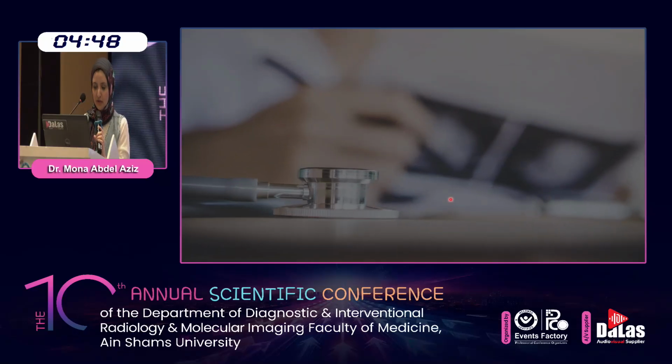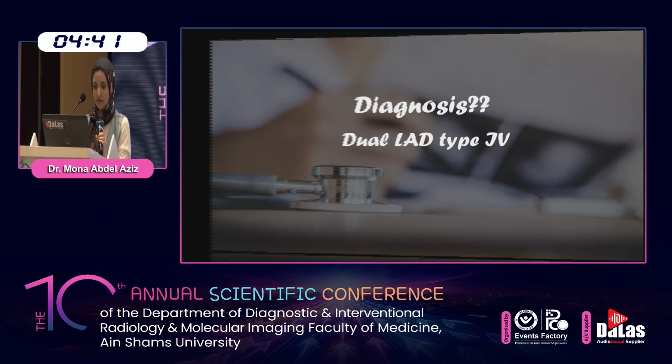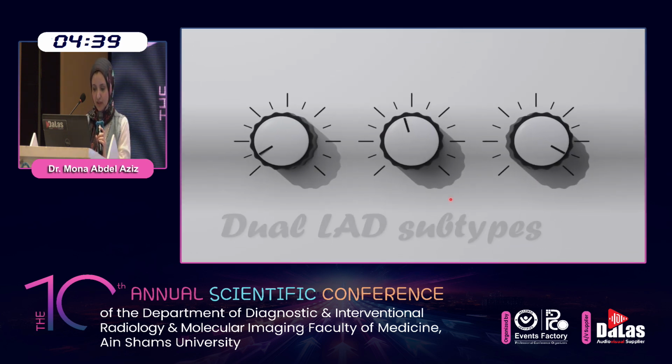So what is our diagnosis? It's a dual LAD case. Which type? It's type 4. And we'll discuss together the types, or the subtypes, of dual LAD in the next slide.